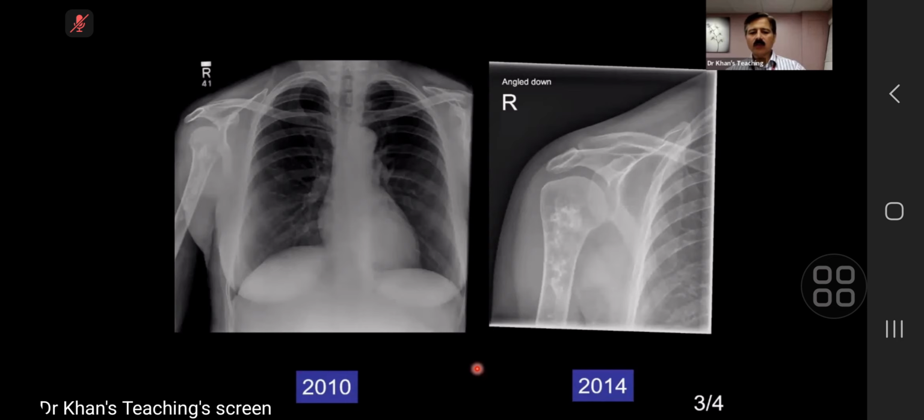You see, if you look carefully, rings and arcs are there. So it is an enchondroma. But having said that, if you look carefully, there is a bit of lucency here. And though it might be difficult for you because the projection is not the same, this lucency was not present. So comparison of old X-ray, one of the aims is to see is there any difference.